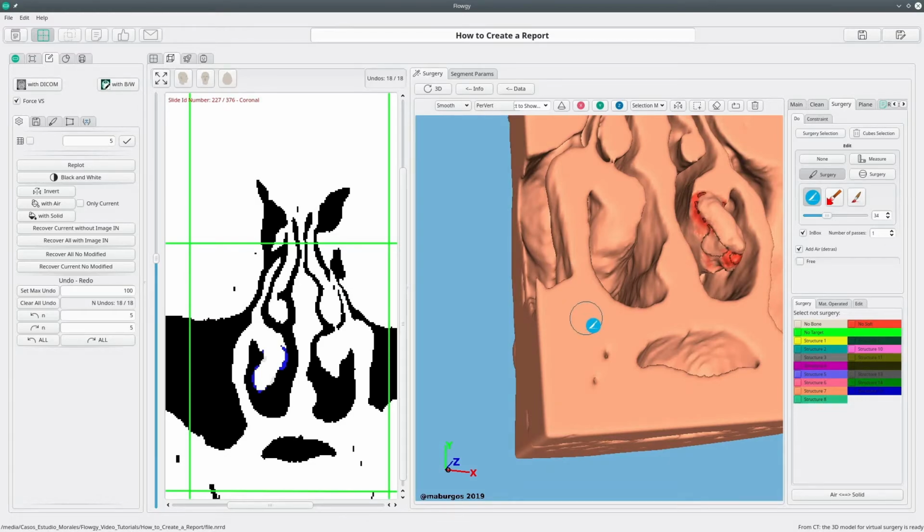An also very interesting and easy to use basic tool is the measurement tool. This tool helps us to measure the distance between 2 points in millimeters, which we establish by pressing the left button on the mouse.